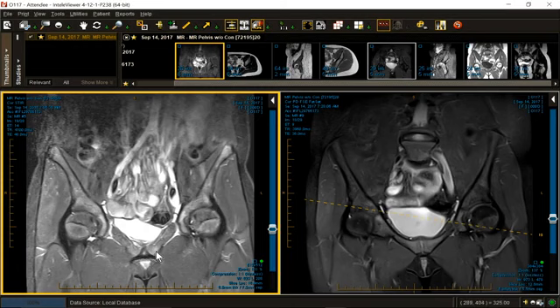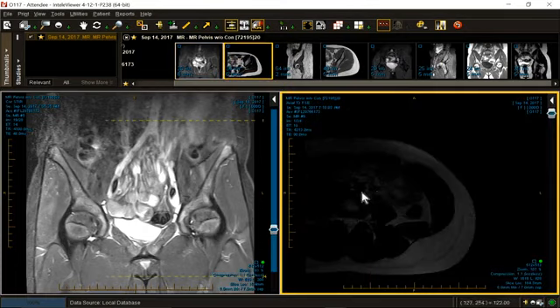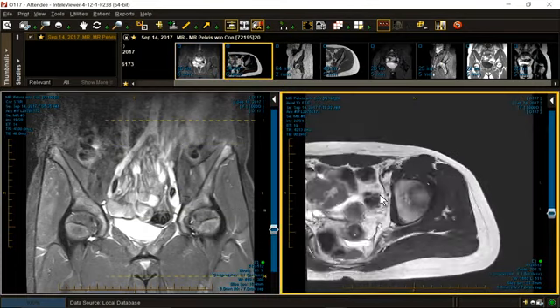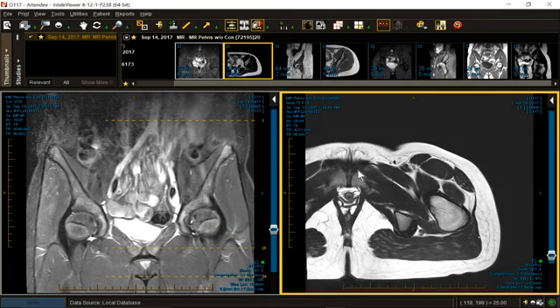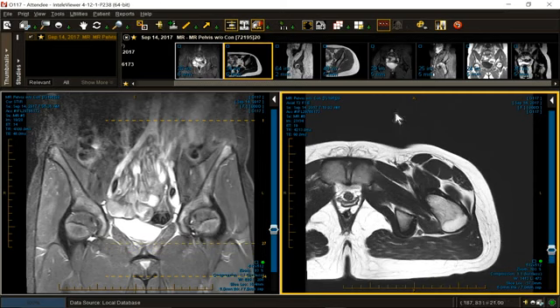We need to do one more thing. You might remember from our earlier discussion, we want to check the pre-pubic plate to see if it's coming off the pubis. How might we do that? An axial. Let's get an axial and see if it's flush on there. No fluid in between the pre-pubic plate and the pubis. And then I like to have a sagittal. I don't know if they gave me one.